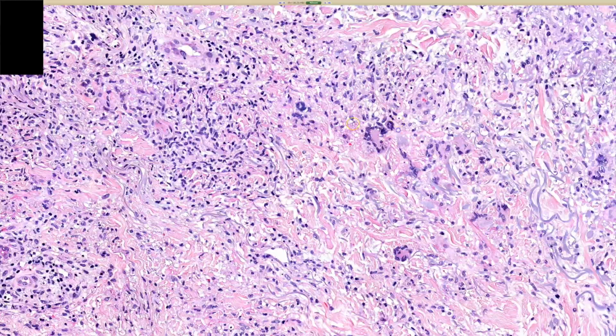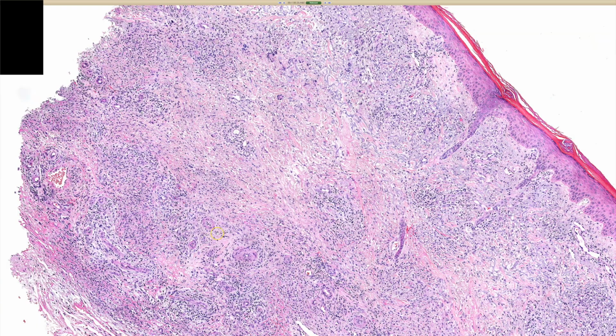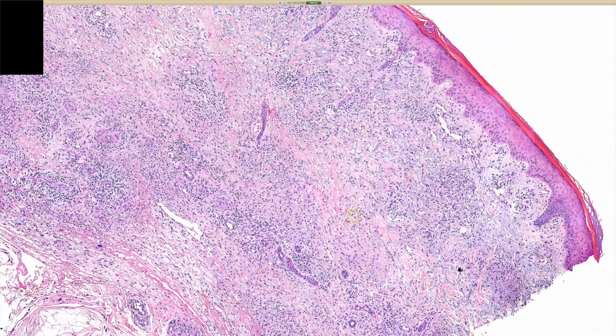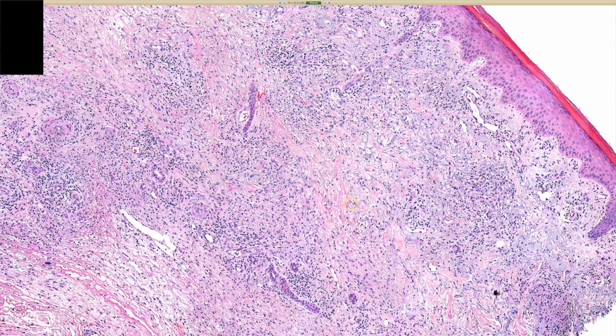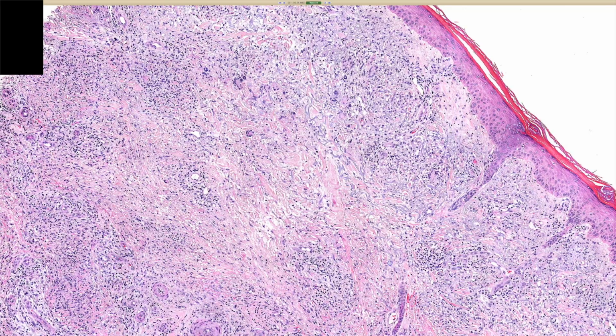So if it's being biopsied as the main lesion and they gave me this, I would say actinic granuloma or, open parentheses, granuloma annulare on sun-damaged skin, which is what I really think it probably is. Or if they wanted it to be annular elastolytic granuloma and it's not a sun-damaged site, okay, cool, we can call it that. But I really think that this is basically splitting and is mostly just academic. These are all just different flavors of a granuloma annulare-like process, in my opinion. So take that for what you will.